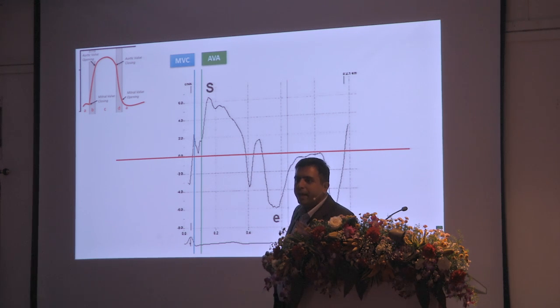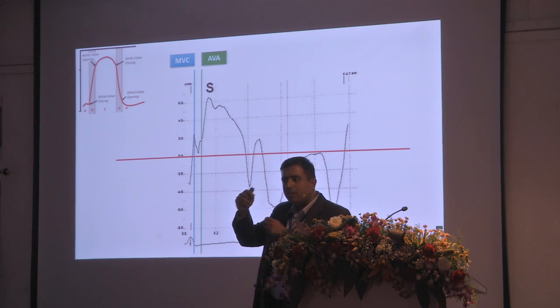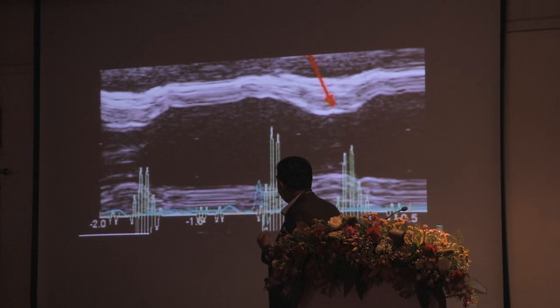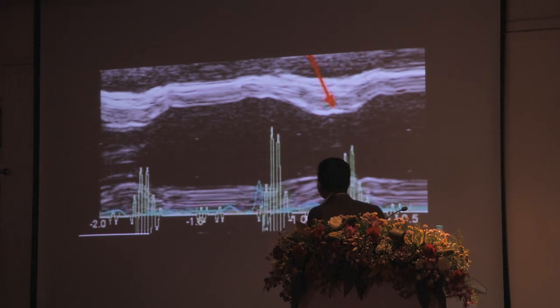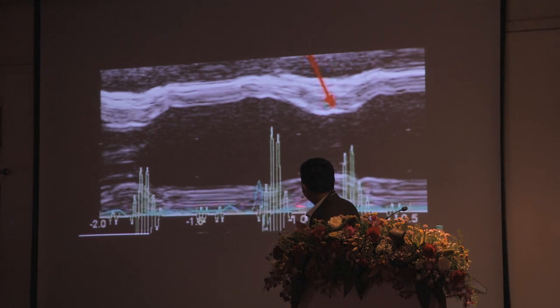And the reason goes back to that epicardial endocardial image that I showed you, that at one point the epicardium is pushing the other way and the endocardium is pushing exactly the opposite way. And we can see this in our Dopplers, our M modes that we do. So if we do a careful M mode, you see what you call a systolic notch. You see that there and the other one there. So this is the point where the aortic valve closes. And it is this systolic notch that will tell us the point where the aortic valve closes.